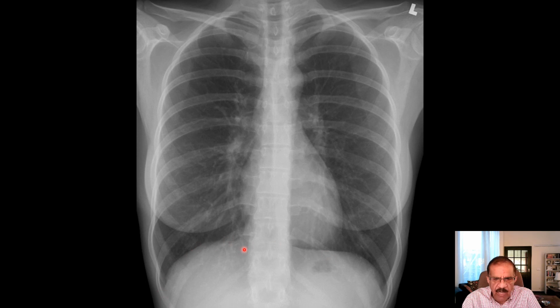Right hemidiaphragm. Same here. Left diaphragm and the gastric bubble. You appreciate the left hemidiaphragm is at a slightly lower level, and then you can see the vertebral column. You can see the right cardiac border, you can see the left cardiac border, and if you trace from above, this is the aortic knuckle, descending aorta, this is the concavity caused by the left atrium and pulmonary artery, first pulmonary artery, then left atrium, and then this is the left ventricle.